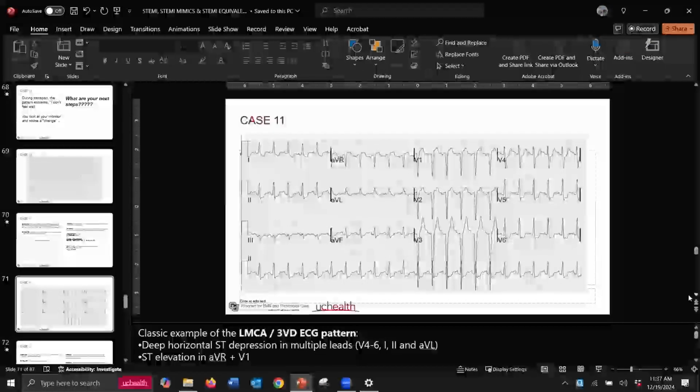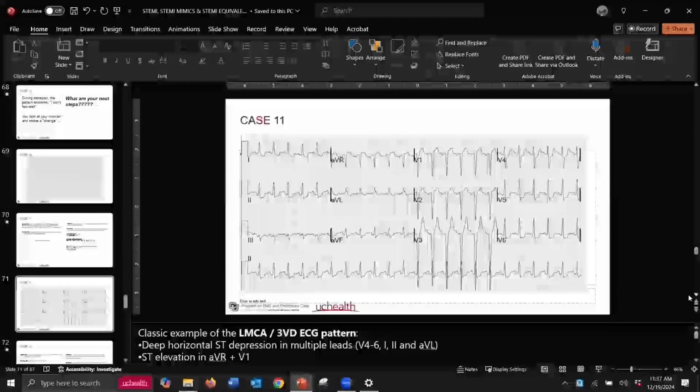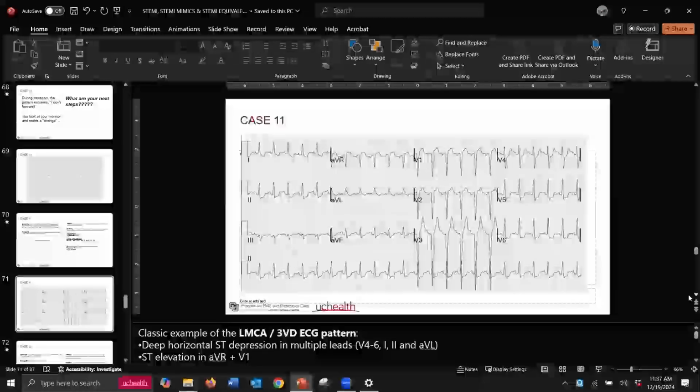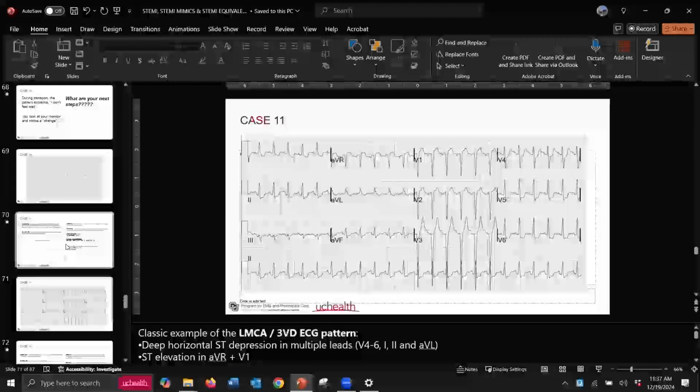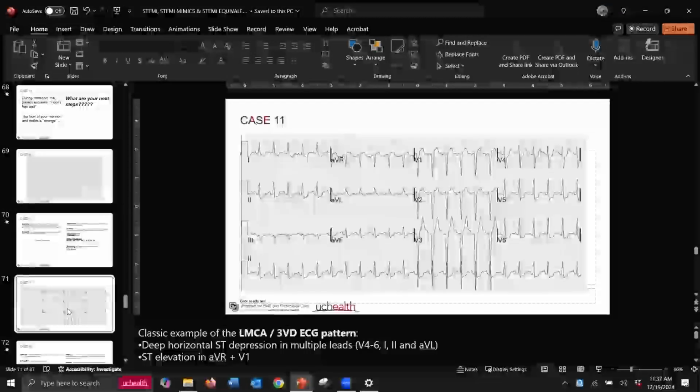Why is he tachycardic? Trying to get more blood. Yeah, absolutely. He's in a compensatory rate. He's got a sick left ventricle. So you look at aVR and V5, V6. Yep, and more importantly, the precordials. He's elevated because it's extending. I wouldn't expect him honestly to have a blood pressure that high. And if it is that high, it's probably not staying very long.